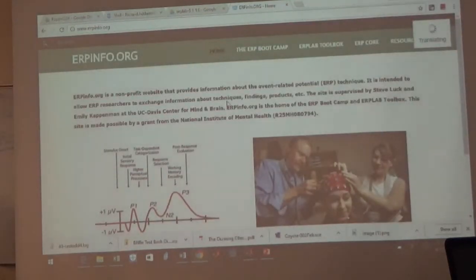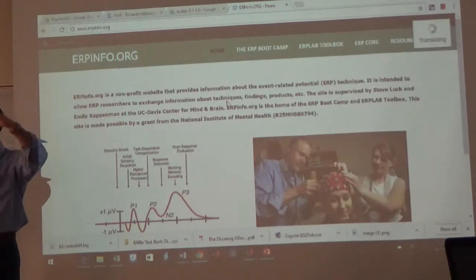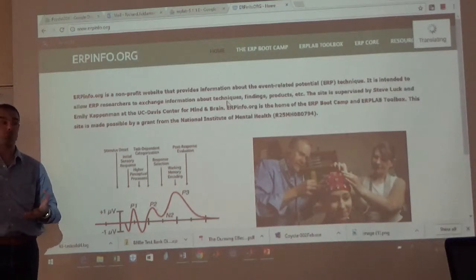Okay. We're just going to download ERPLab. Okay, that'll take just a second. Sometimes it acts a little funky, and I've noticed in other classes when I've taught this, when I give a folder to people, it'll work at first, but then it'll give an error message like this. It works just fine if you download it yourself from the original site. I don't know why that is the case. I've just noticed that this is one solution that we can use as a workaround.